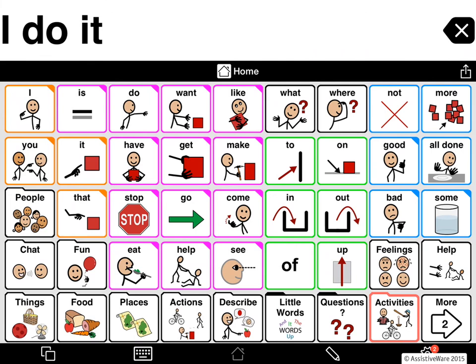So we've seen how to make things larger. Sometimes, especially for people with visual processing issues, it can be more important to make things higher contrast, or to use certain colors that are easier to process than others. We saw that with the Keeble keyboard that we showed you earlier. We can do this by changing the colors used for screen background, button borders and backgrounds, and for fonts. And David's going to show you how to do this.